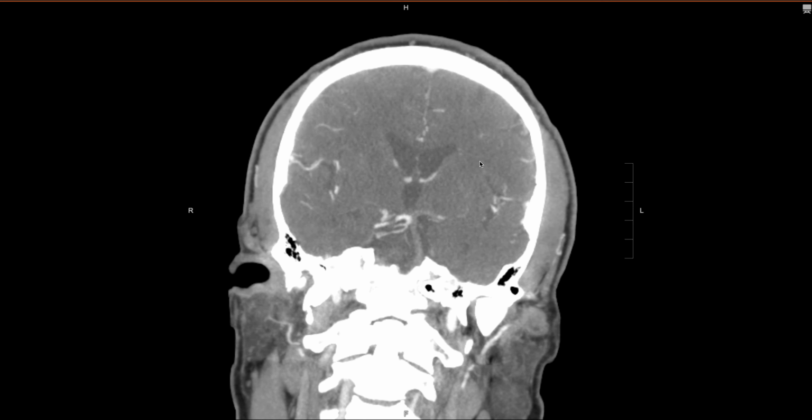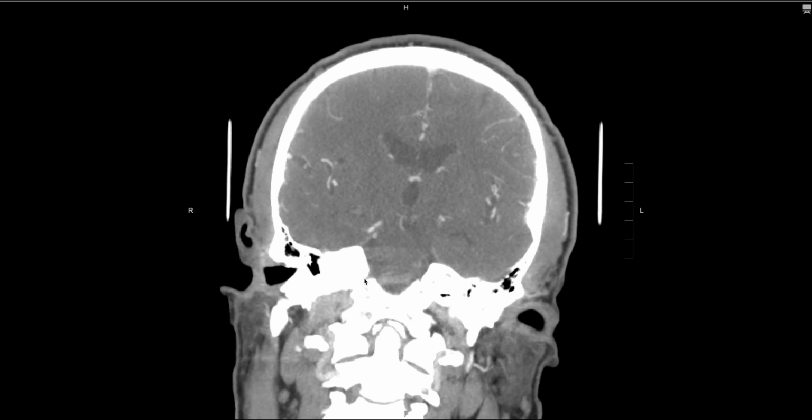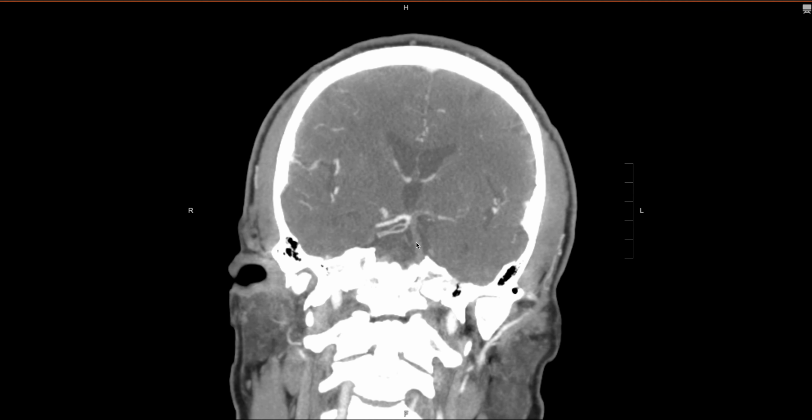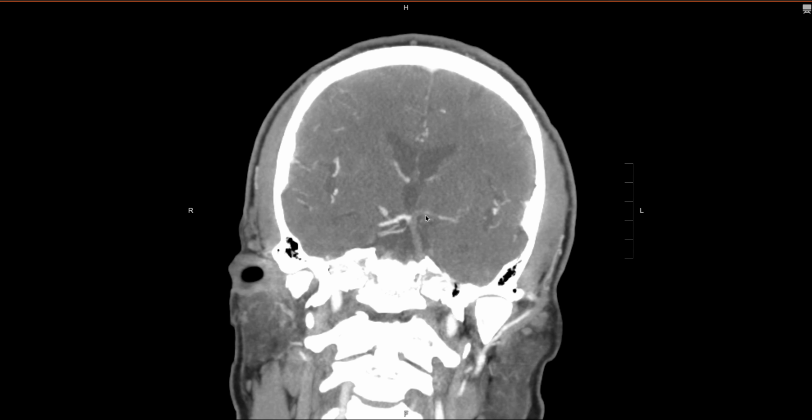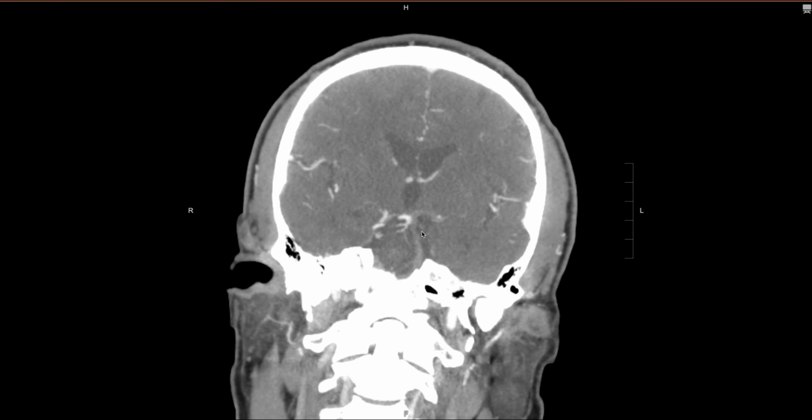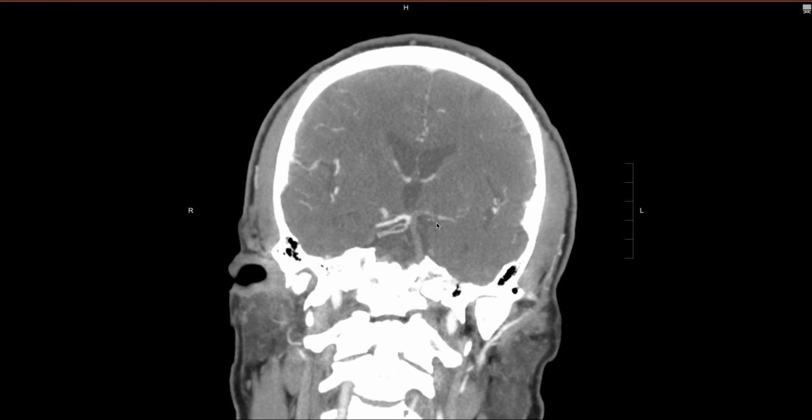And similarly, like the non-contrast imaging, you want to use your coronal to really make the diagnosis, because this gives you a really good look of the entire basilar artery, and then you can see how that left PCA comes off not opacified, especially in the proximal component, and then the right PCA is opacified. So this just shows you the extent of the thrombus that is there.